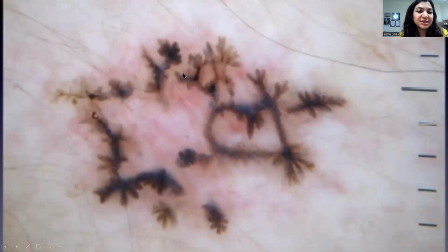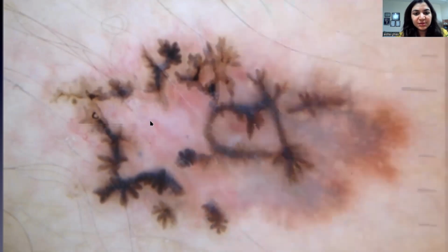Another pigmented BCC. So in this BCC, you see pigmented lines in the form of streaks. Some of them have the same origin. See these three paw-shaped or three lines coming from the same origin. And then over here, floral structures, you may call them cartwheel appearance or maple leaf appearance. So this is typical for pigmented BCC. If you come across such a lesion in life, you instantly say, okay, fine, this is BCC.